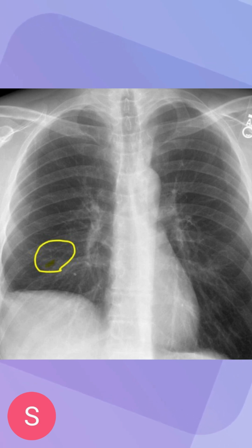I'm not sure if you guys can see it, but if you look almost at the center of the yellow circle, you can see two small white dots, and those represent very small pulmonary embolisms. We can say they're pulmonary embolisms because they're outside of the main vascular system, outside the main branches. Essentially, what they're doing is blocking the flow of blood away from the main system.